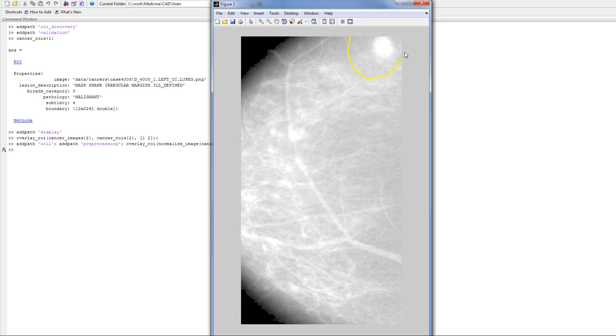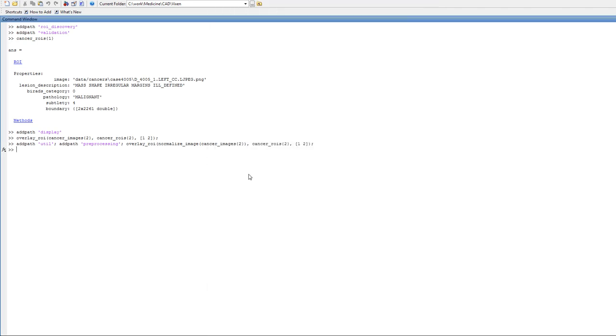We have drawn a circle around it. This image has already been segmented, as we call it. That means that we've taken the image and we've extracted only the most interesting parts according to the algorithm. The lesion falls within the top right corner of that, so it looks like we've taken a successful segmentation. We also have a less aggressive form that only segments out the breast, and that's what we use to report results back to the user. So here, that's clearly the ground truth, so that's present within the image.